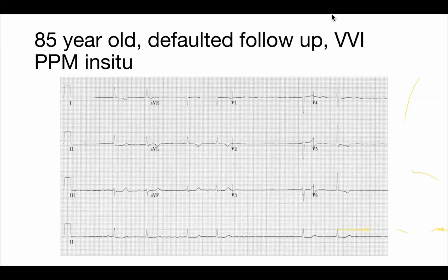Do you see the P waves here? You don't see well-formed P waves, huh? No. So this is actually slow atrial fibrillation, right? And is the pacemaker working here now? If they ask the complete diagnosis here, it should be slow atrial fibrillation with non-functioning pacemaker.